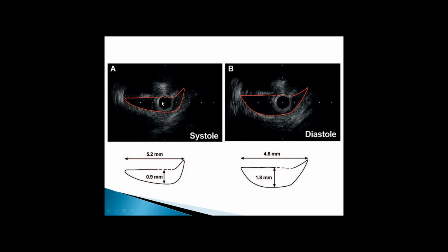having severe stenosis. This is the size of the probing device for intravascular ultrasound. It's larger than the opening. The distance from here to there is about 1.1, 1.2 millimeters in diameter. So this is the most severe type of stenosis that justifies the symptoms, especially with exercise.